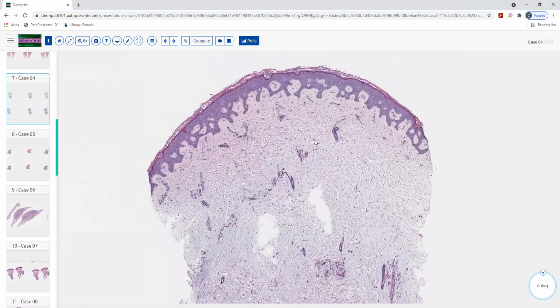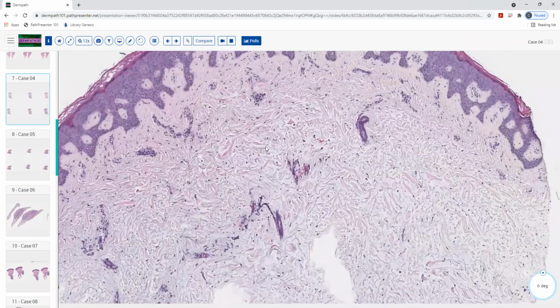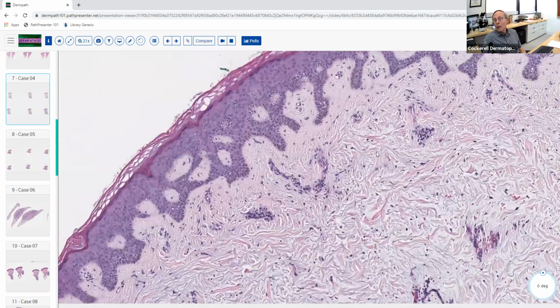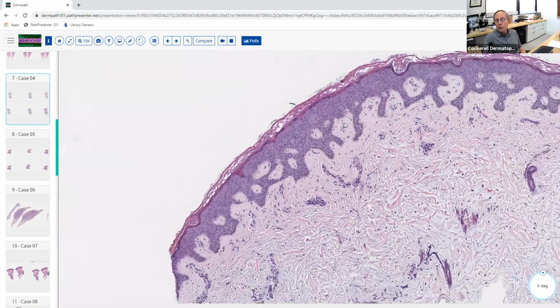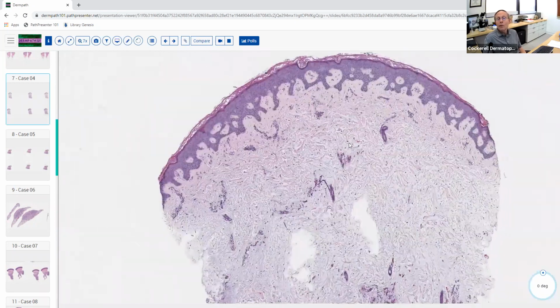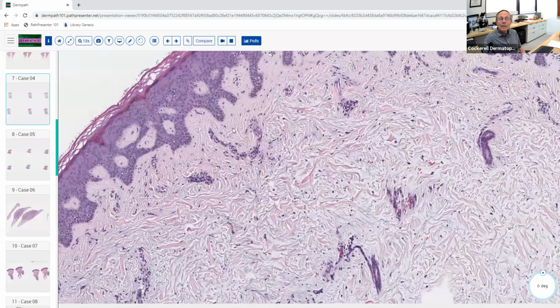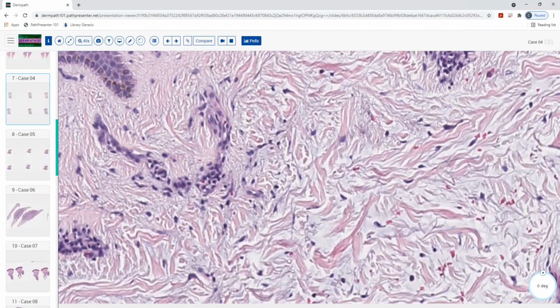It's kind of hard to tell, but there's a couple of little clues. So we know a lot of places where it's not, right? It's not on the face, certainly not an area where there's a lot of hair. There may be a couple of hair follicles in there, but they're not very many, at least in this person's biopsy. It does have these kind of vessels here that are thick-walled and kind of prominent.